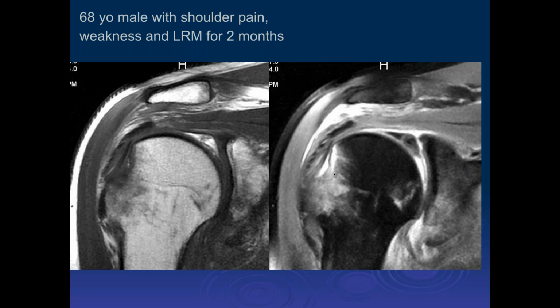Well, what do you think happened here? What's the mechanism of injury? Traction? No, I don't think so here. Let's see, and then you can see that there's also what's going on up here. It looks like the superior labrum is torn and avulsed. Okay, but what is this? That's a biceps labral complex.